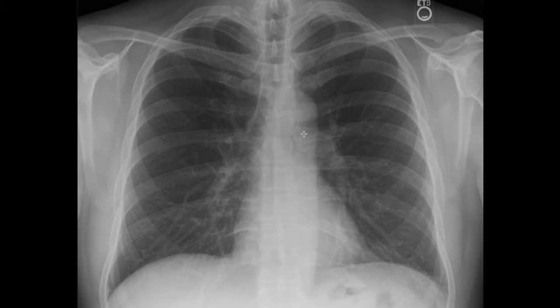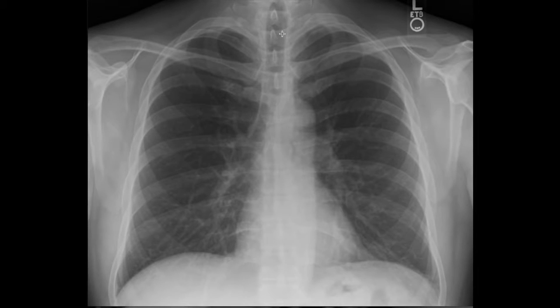Then you have, what else? This is now the bony region we talked about. I'm not sure if we talked about it, but these are the ribs. We see the first rib right here. It's like a C shape. It's a very special rib. And then this is the area that forms the thoracic inlet.